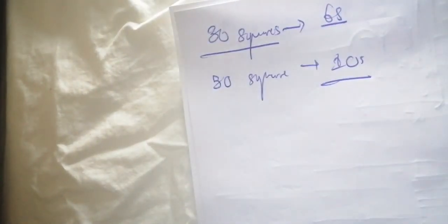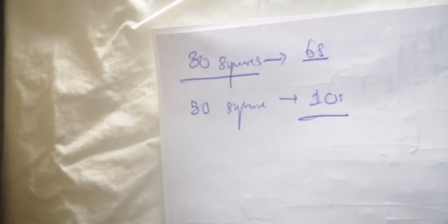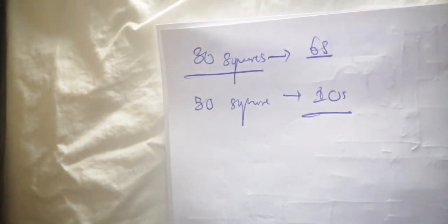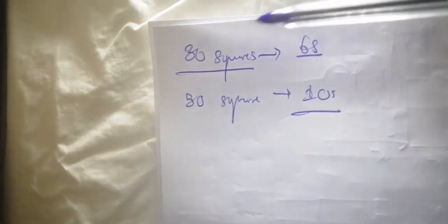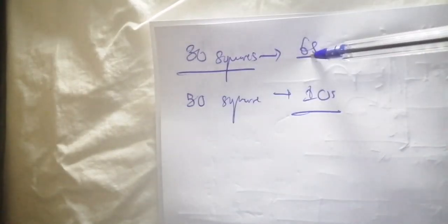And actually, this is going to help you in the rule of 6 and the rule of 10 that you are going to visualize later on in the physiologic ECG interpretation. Is it clear? So let's start with the rule of 6.